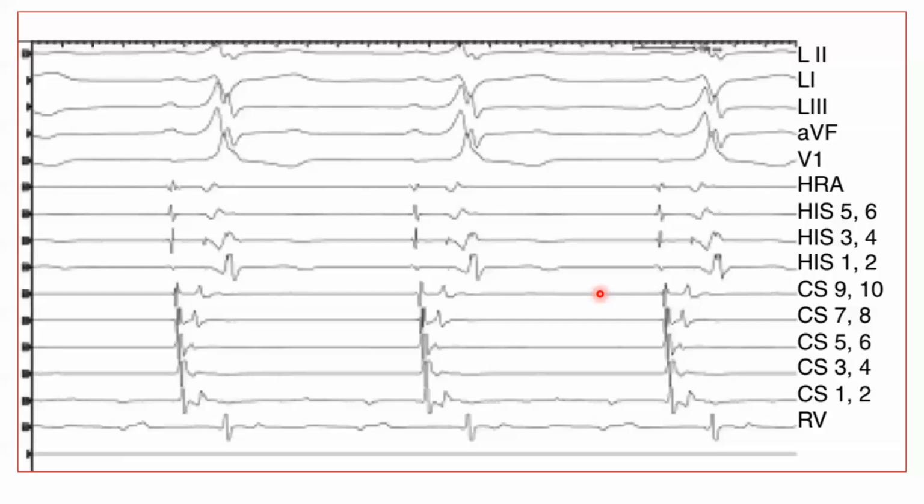Lastly, we'll have AV tracing. As you see here, we can see the surface ECG, the right atrial lead, the CS lead, and the RV. Look for the first electrical activity. First electrical activity is atrial activity, the A wave. A wave is coming to the ventricles in a concentric way. Here we can see the A.